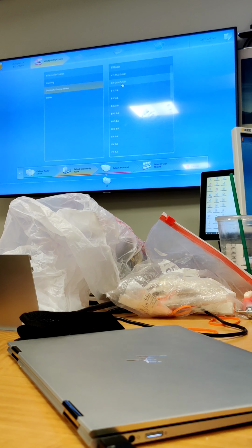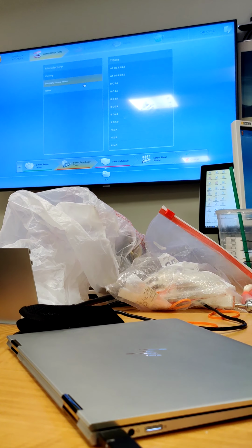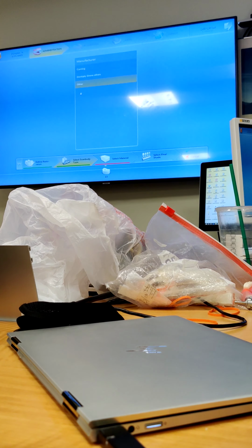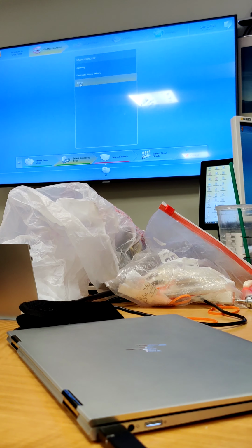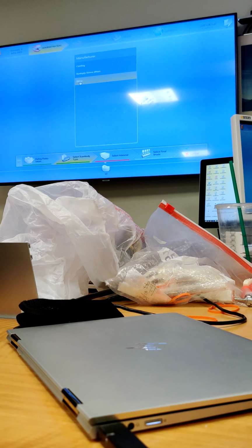I don't personally like doing tie bases. I think they waste time. So what you can do is just say other, okay? And just other, because we're not seeing a tie base. We're going to take an impression of the implant and send it to Atlantis or Zento or Simplant, right?